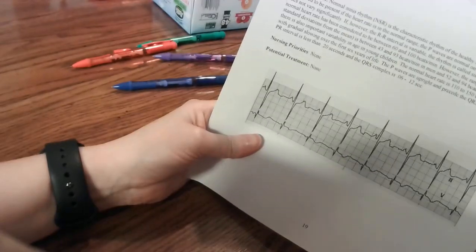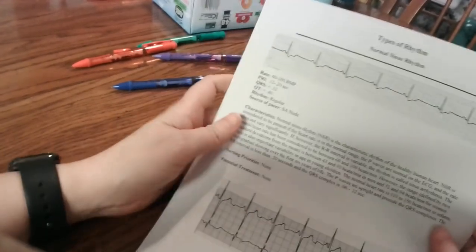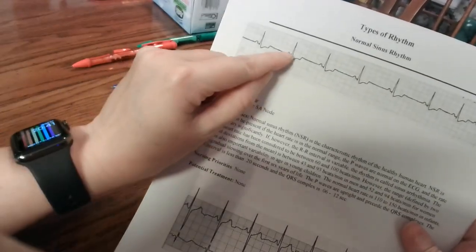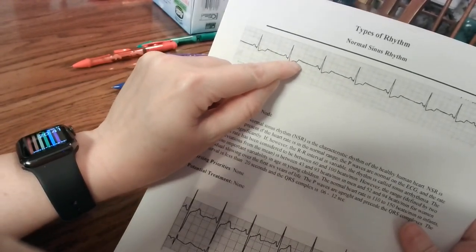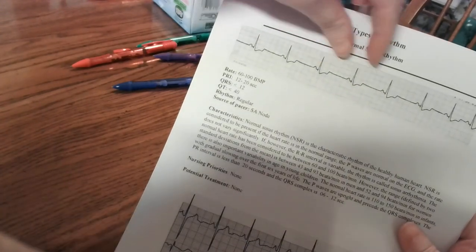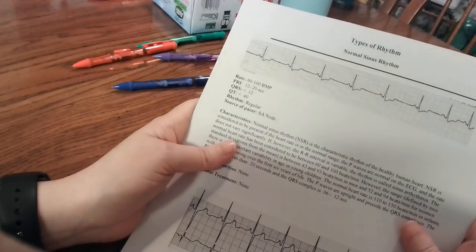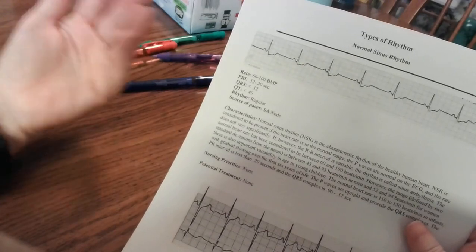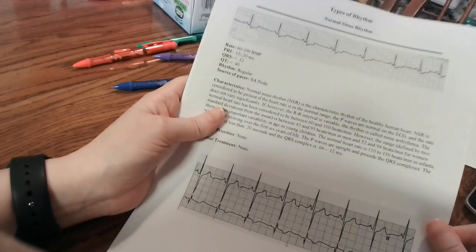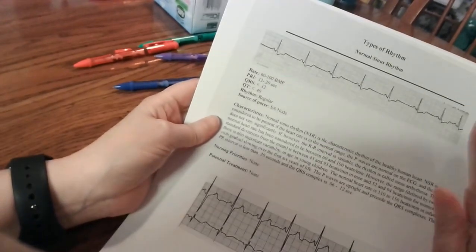Pause. All right. And here's an example of this one. That other one probably is too. This is an example of normal sinus rhythm. To have normal sinus rhythm, it has to have a P, QRS, and a T. The rate has to be regular, so if you were to take calipers and measure that off, it's got to be the same distance each time. And then there's one more thing. Oh, and it has to be between 60 and 100 beats per minute. So a lot of times we call stuff normal sinus rhythm, but it's not really normal sinus rhythm. It might just be sinus rhythm because it's mostly this, but not always this.